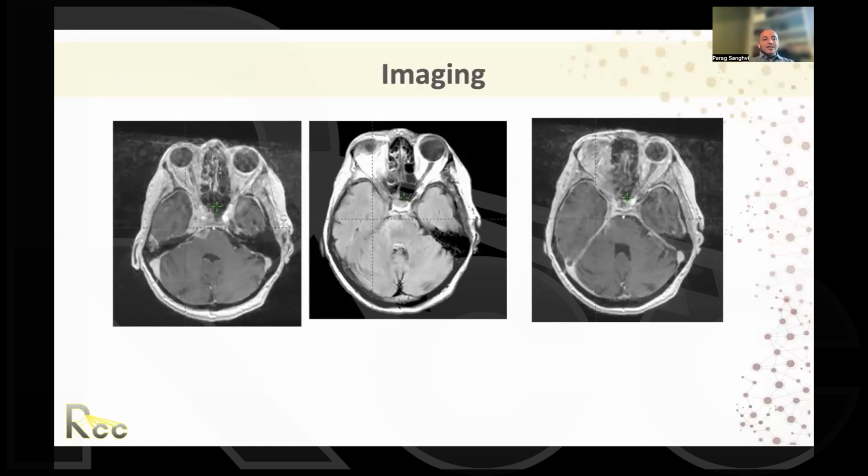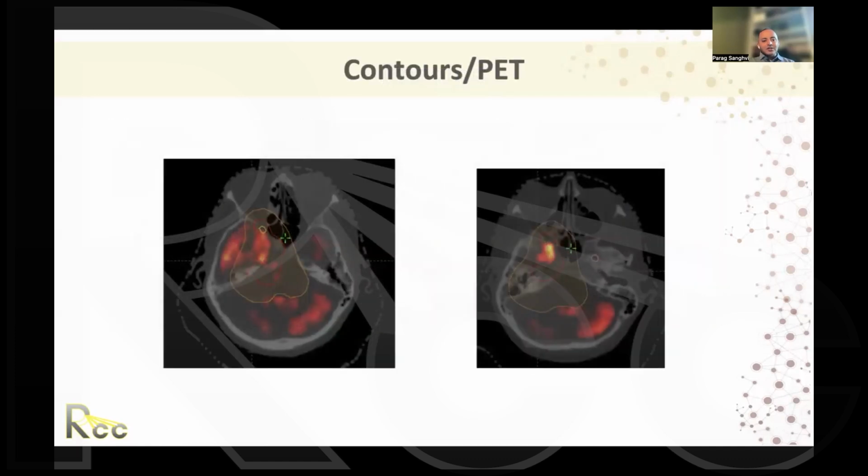Now you can see this tumor intracranially, along the superior orbital fissure, going into the cavernous sinus, into Meckel's cave, into the sphenoid sinus and the sella, and then into the brainstem. Here's T1 post-contrast MRI. Here's T2 MRI sequences. So you can see very, very extensive disease. She ultimately had a biopsy 7 years later. This was metastatic cutaneous squamous cell carcinoma in this patient.